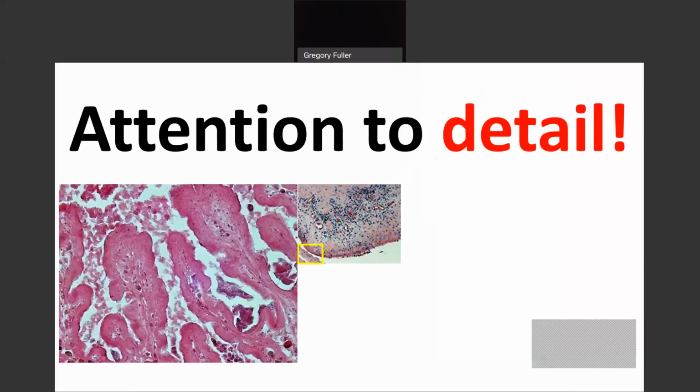All right, and you're going to have to recognize that as a little bit of this foldy, wavy part of the worm. Everything else is going to be fibrogen, collagen, inflammatory cells, reactive glia, all of that. Because the worm will have died, and that is what elicited the inflammatory reaction, and it's been dying, necrosing, falling apart for days, if not weeks. And then the surgeon goes in to get it, and this is what you get, or a fraction of this with all the inflammatory tissue. Got it? Attention to detail.